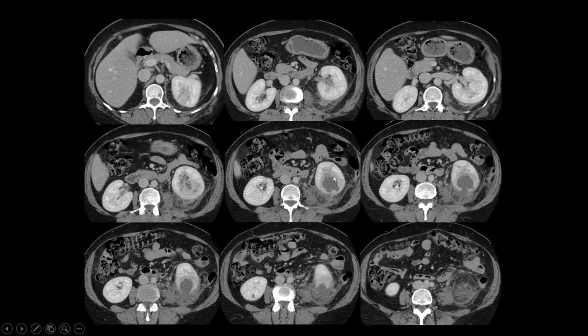It tells us that this cystic lesion is most likely an infected lesion, and this turned out to be an abscess. And the defect indicates perforation into the perinephric space. So this is perforated renal abscess. This is one of the complications of urinary tract infection. Of course, we need to differentiate this from cystic renal cell carcinoma. The presence of significant inflammatory changes around the kidney, the presence of history of urinary tract infection, and the edema around the cystic lesion all help us differentiate between cystic renal cell carcinoma and renal abscess.